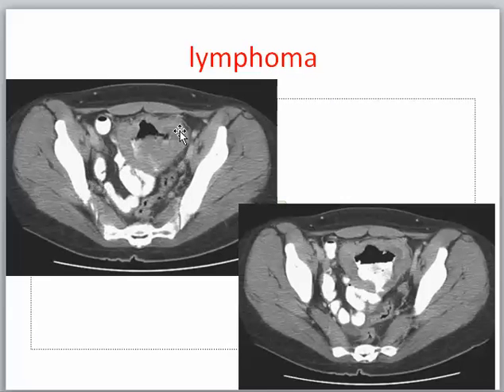Lymphoma can obstruct by producing such large soft tissue tumefaction encroaching on the lumen, and thus result in aneurysmal dilatation of the lumen in some parts. And here the principle of being extraluminal, as in any stromal tumor, is present. Most of the tumor is outside the lumen and causes aneurysmal dilatation because of the stricture at this area. So stricture, aneurysmal dilatation, and marked thickening of the outline.